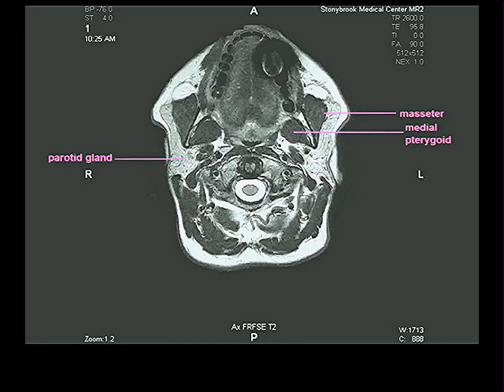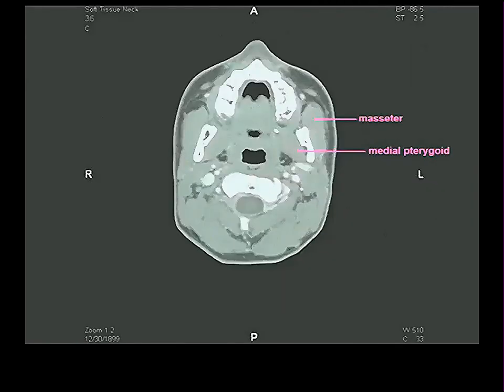One thing I didn't think to mention, I'm going back very quickly, if I can, to the ones we looked at before. Here's the masseter. Here's the medial pterygoid. I'll go back to here. I know this is not masseter, but I can't tell from looking at this what it really is. And in fact, this is probably this thing here, which sort of goes behind and then overlaps the masseter. You can see a little indication right there.